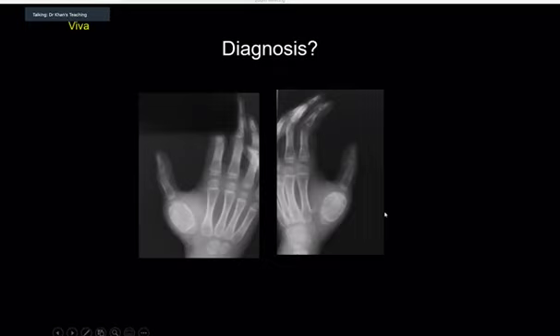It is what we call sclerotic. If you see what is happening, look at the age. It's a young age group. Of course, in some of the syndromes, which we will learn next time, enchondromas can happen. Enchondromas usually are not as expansile in the metacarpals. They will be lucent. Chondroid matrix is calcification. They will be lucent lesions. This thing is not lucent. It is causing expansion of the bone like anything.